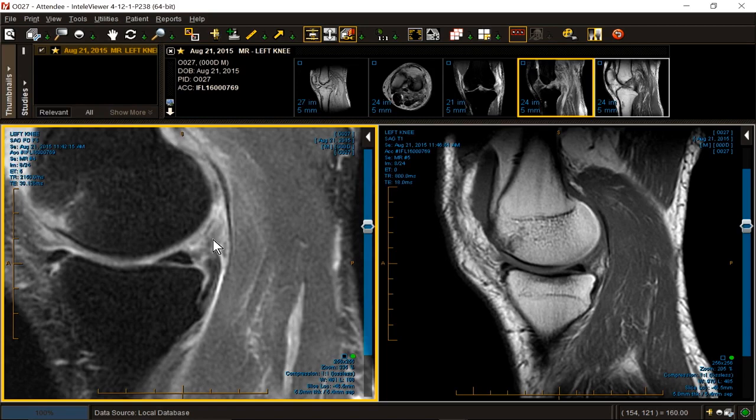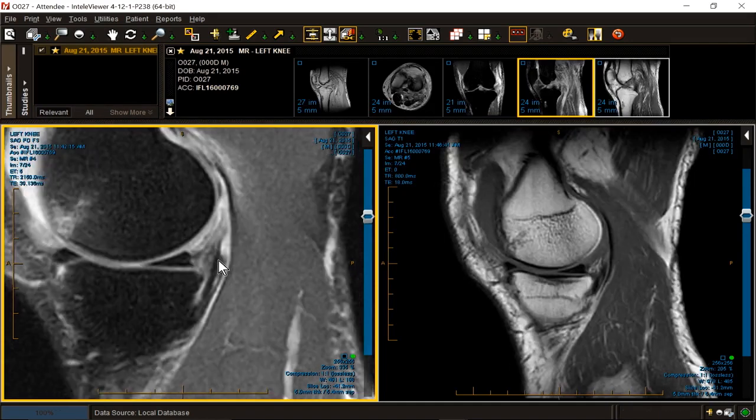So the OPL on the medial side is gone, the OPL on the lateral side is gone, and everything in between is gone. So there's a posteromedial corner injury and a massive posterolateral corner injury. An ACL, a PCL, and we can describe the individual subsegments of each corner that are gone.